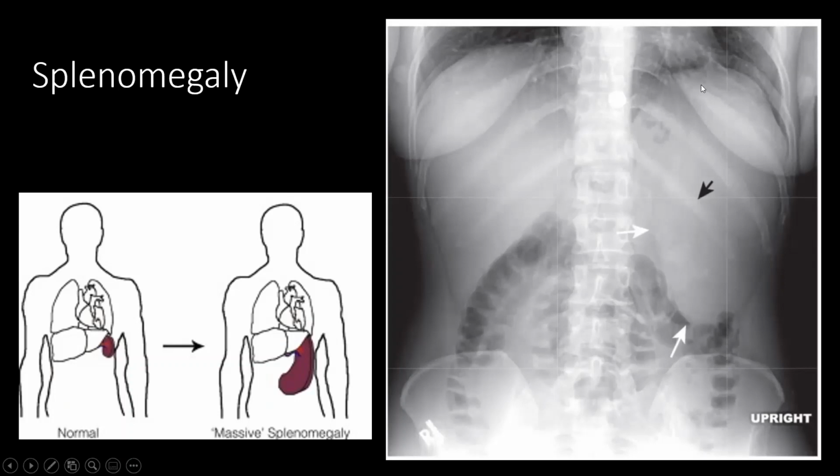Okay, so the next time you examine for any enlarged spleen, you will know why we examine it in a diagonal way, because it grows diagonally because of this phrenicocolic ligament. So here I have this enlarged spleen over here, and the liver is going normal inside, and this is all the pattern of the large bowel going downward and being displaced here because of this enlarged spleen. And this is a patient that has an upright abdomen, and I can't appreciate the gastric bubble because of this enlarged spleen that is occupying this space.